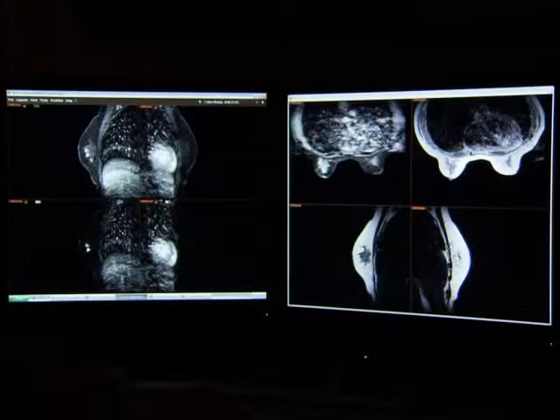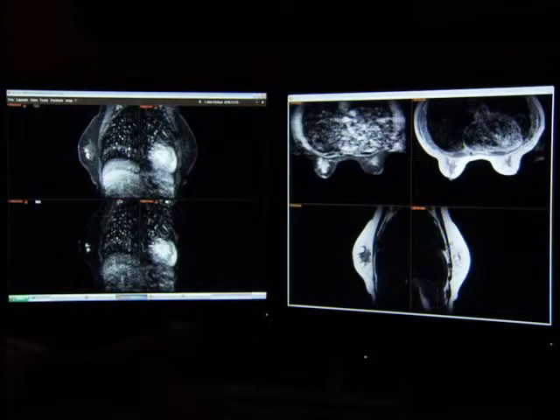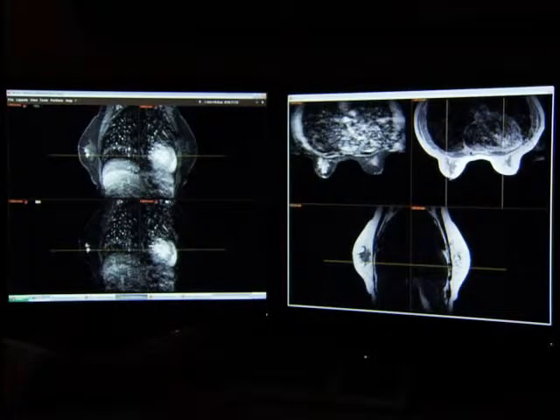Again, you can cross-correlate with multiple pulse sequences, evaluating one of the enhancing nodules in the right breast, and cross-correlating its signal characteristics on the STIR pulse sequence allows you to evaluate what it looks like on T1 as well as STIR imaging, or if wanted, on a fast-spin echo T2 non-fat saturated sagittal acquisition. Again, this greatly aids the speed and ease of evaluating multiple pulse sequences.